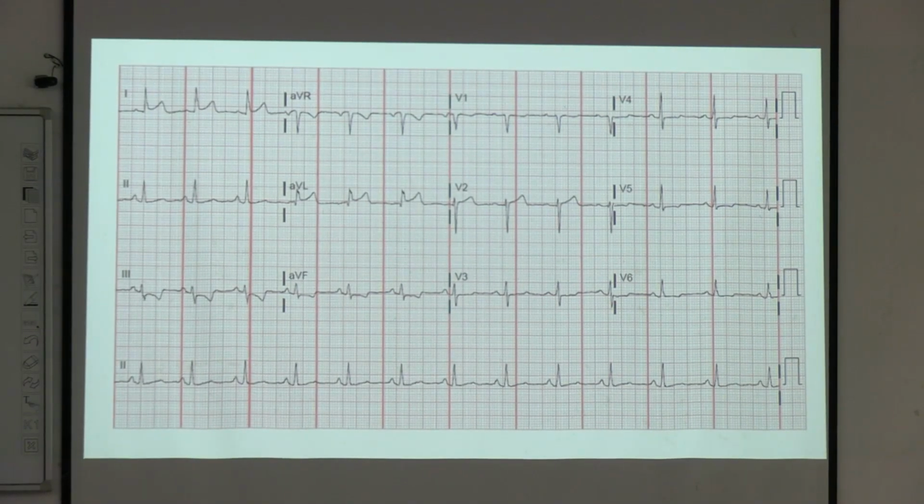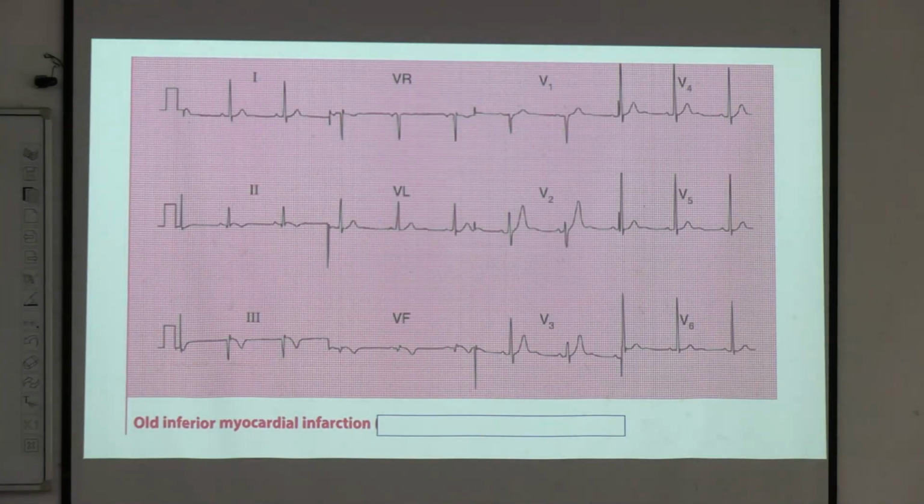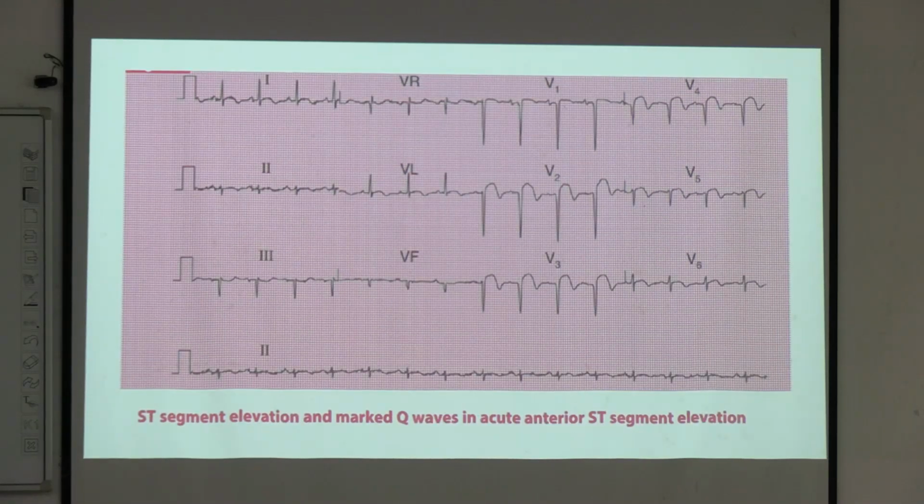Okay, what to see over here? You see ST depression, right? ST depression in lead 3, aVF, that is not whole thickness. Okay, this is subendocardial, non-ST segment elevation myocardial infarction. What is this? This is old. Anyway, old is difficult for you. I'm skipping this.